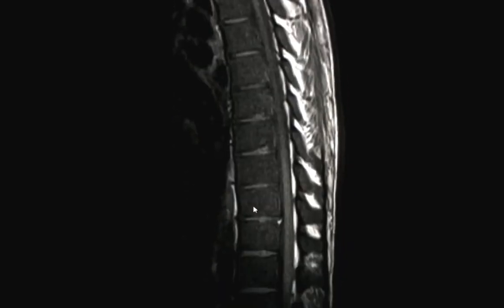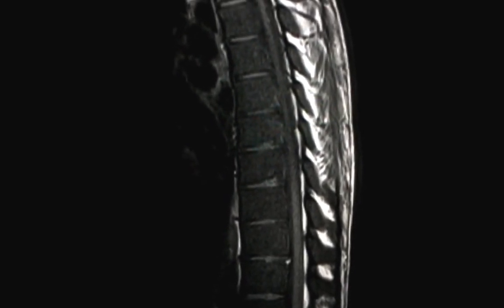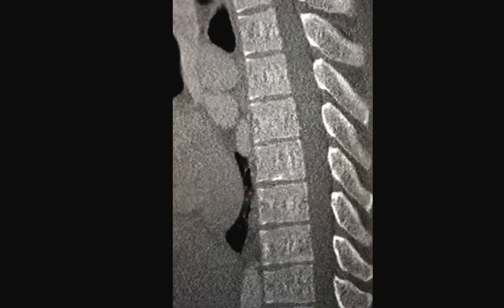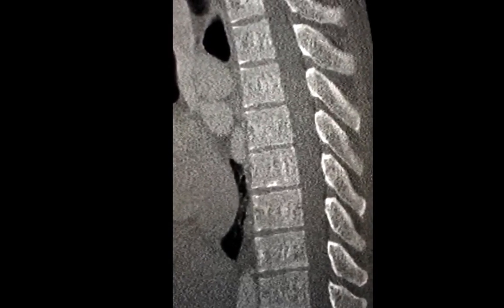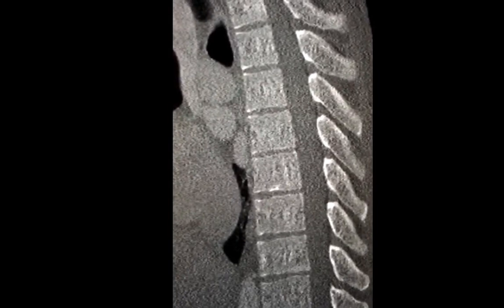The second teaching point is to remember the differential diagnosis of diffuse low signal intensity of the bone marrow on T1. The differential diagnosis could be remembered under these four big categories: chronic anemia, malignancies, myeloproliferative disorders, and sclerosis. The final teaching point is to remember the appearance of thalassemic bones on CT as bone expansion and coarse trabeculations.